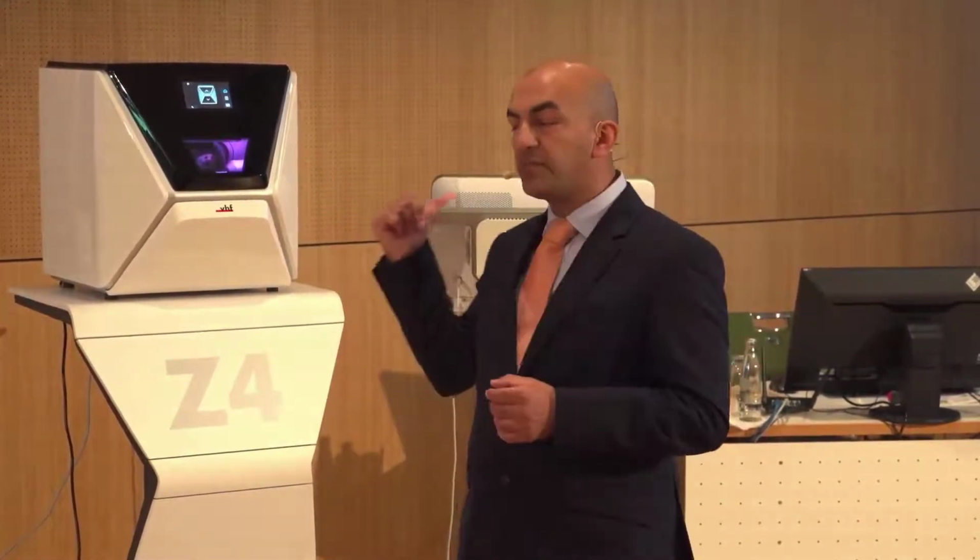So we're really going to go through different complexities. We're going to do a very simple case. We're going to be milling live. My colleague Udo is going to help us with printing, so we'll be printing live as well. So let's kick off.